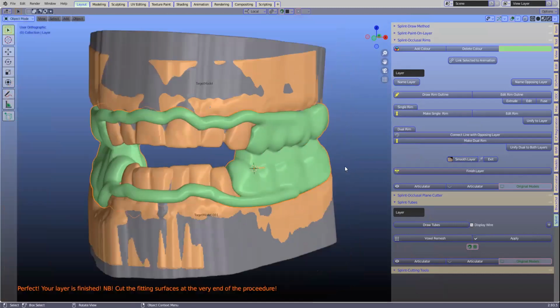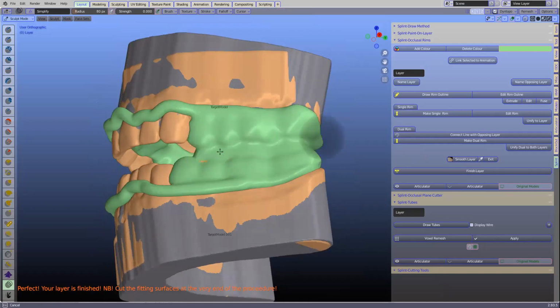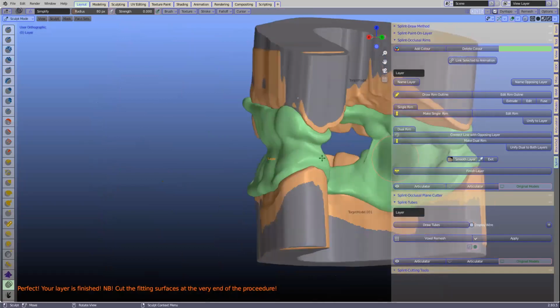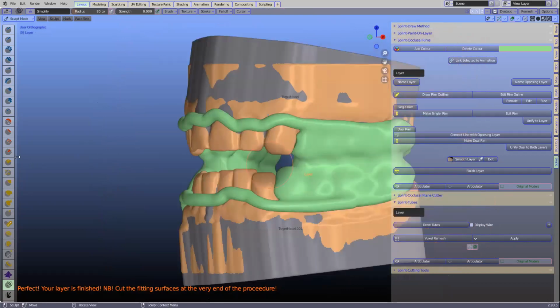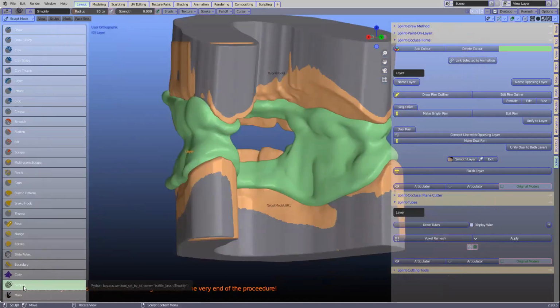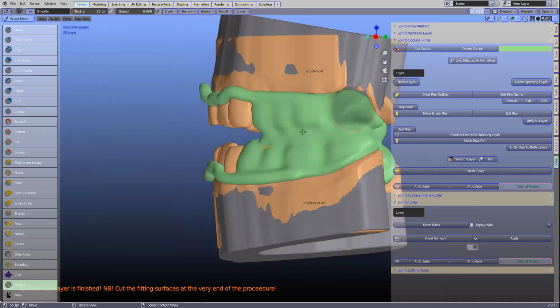And of course, if you wanted to smooth that, you can still smooth it, because remember, this layer has been sort of fused with the other side, and it could be a good idea just to give it a quick smooth. What this sculpting tool actually does, if you look on the left hand side, it's on simplify. So it looks like we're smoothing, but inside the mesh, it's like ironing out the creases. You take an iron and you're ironing your nice white shirt, you want to go out on a date or something and it's got creases. We're going to iron out our green splint.